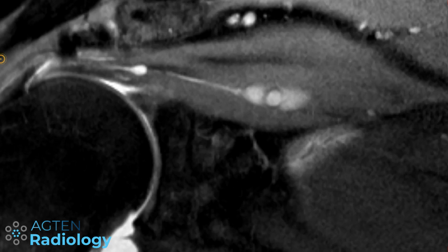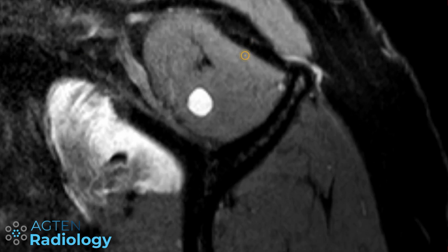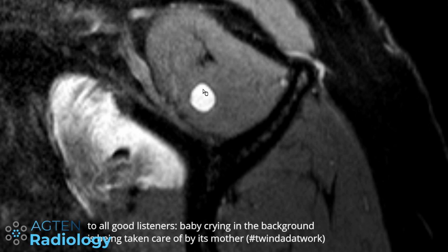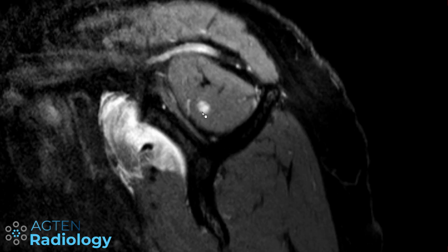And if you look closely, you can see we have from the cyst here a tiny fluid streak going laterally. Here is a second component of that sentinel cyst, and then we kind of lose it here because we have thick slices. But let's have a look at the sagittal view. Again, this is a proton density weighted sequence after arthrography. Therefore we have this extravasation here at the typical location. So we have the cyst in the supraspinatus muscle, as you can appreciate here very well.